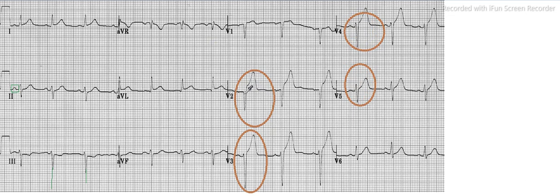You see here, this is Q and it is moving up, and you see here the ST segment. So it is elevated. You see here the baseline, the PR isoelectric line. So I draw the isoelectric line here. So this will be your isoelectric line somehow, isn't it?